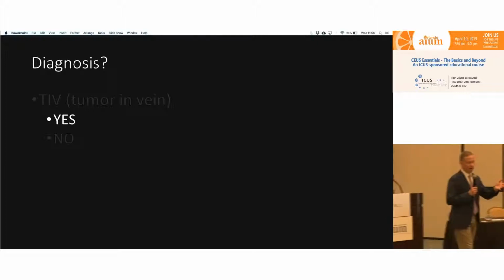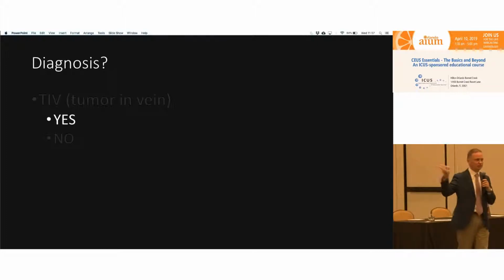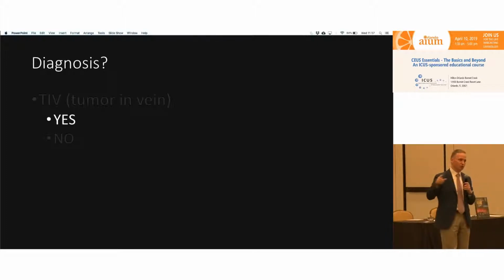And I'll let Stephanie maybe comment on this, but in my experience, recanalized bland thrombus in the portal vein almost always leaves some areas unenhanced. Right? You're going to see some channels running through in a portal vein phase, but there will be some clots still remaining in there. It's hard, yeah, but if you see something like this distended portal vein with arterial phase hyperenhancement, and timing is the key, because the difference between arterial phase and portal vein phase in liver, sometimes 5 seconds, sometimes 10 seconds.